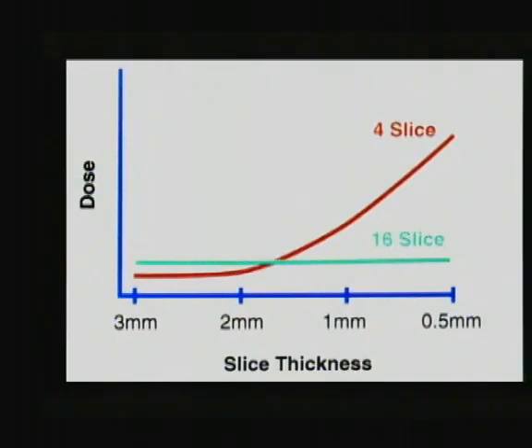An elderly patient came with a pain in the back, and this is what it showed. And you look in the middle of the thoracic spine, and there is an injury. And knowing that these injuries don't occur with meager or little trauma, we were obligated to do a CT of his entire spine. We diagnosed that pre the CT as a posterior fracture dislocation. We'll go into the classification in a few minutes. And ideally, you should do CT.